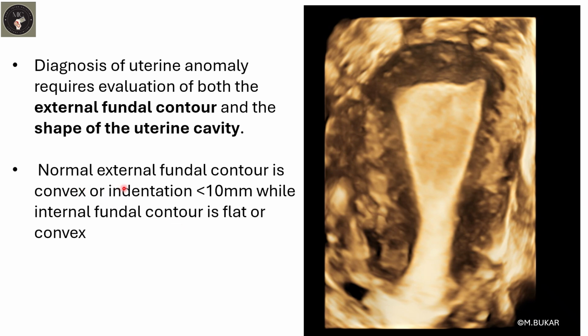The normal external fundal contour is convex or has an indentation less than 10 millimeters, while the internal fundal contour is flat or convex.